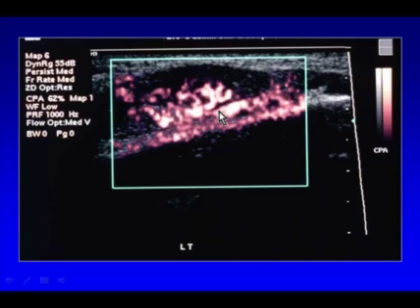So again, the surgeon was able to know that this, in fact, was a hemangioma. And it was known that when they went in for surgery, they had to be careful because of the degree of arterial flow, this was a high risk of bleeding, certainly a higher risk of bleeding than the venous malformation that we just showed.